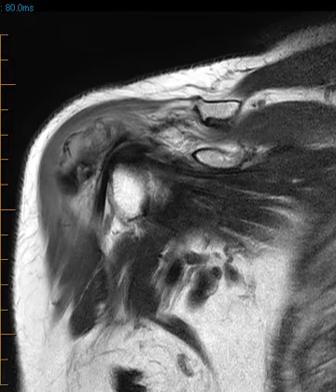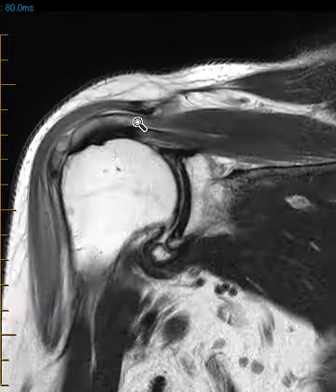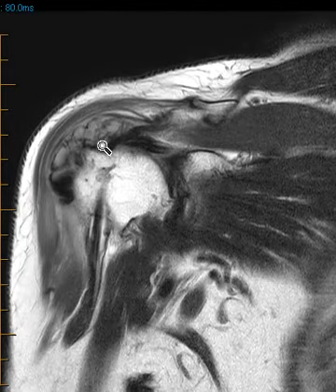Before that, though, I'll put on a T2 weighted sequence here. We see the supraspinatus muscle, supraspinatus tendon. Looks like the tendon is intact, and so this stuff really is predominantly over the bursal surface, may dissect into some of the bursal surface fibers. So it does look like a case of calcific tendino-bursitis, but again, just much more advanced than I usually see. And here's this low signal.